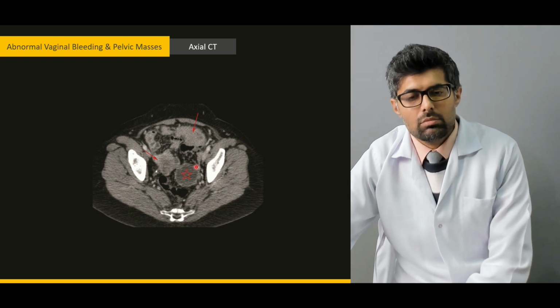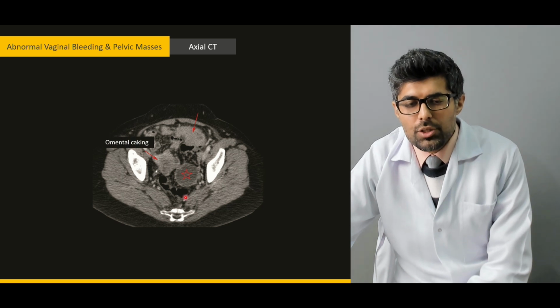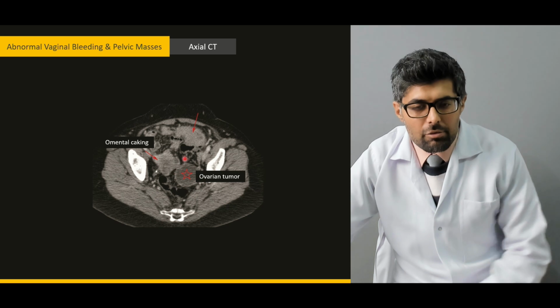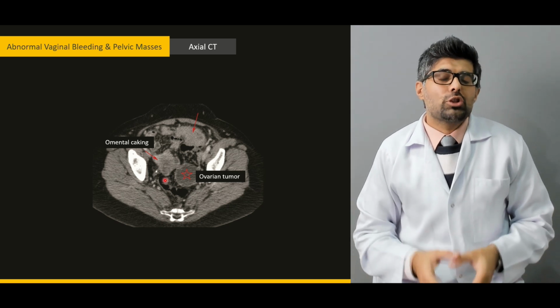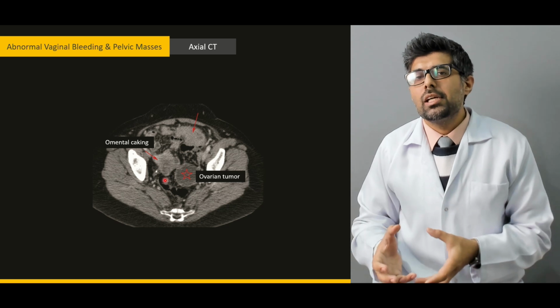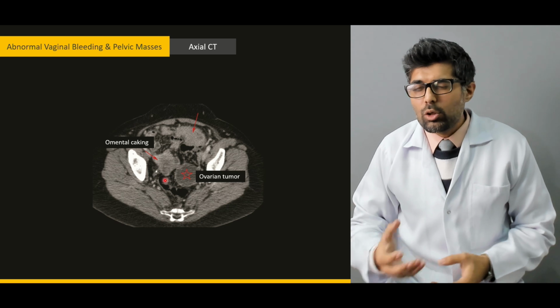Next, again, we have an axial CT of a patient with a solid ovarian tumor with omental caking. Omental caking is a term used in radiology when there is malignancy and metastasis.